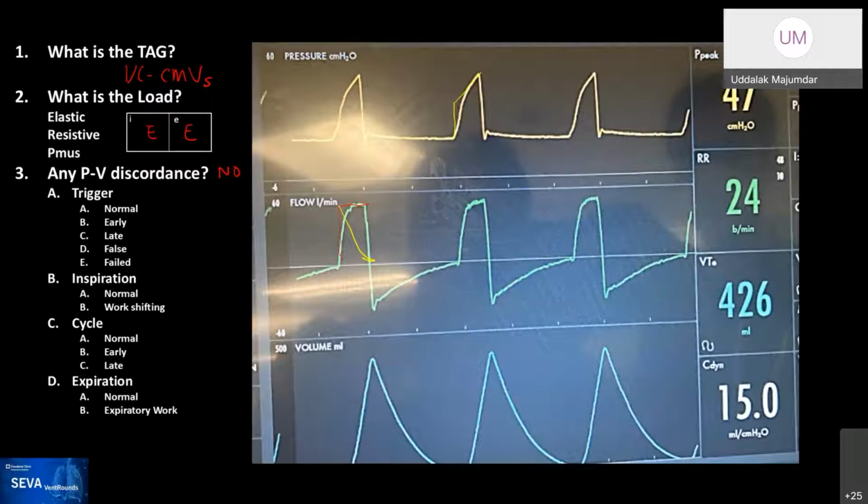Do you see any evidence of patient activity here? Yeah, true. No, right? So that makes no sense in the book. Now, if you're talking about somebody who is spontaneously breathing, it may depend where the patient is and how they are asking for the flow, and there may be some role to adjusting the rise time in patients that are spontaneously breathing, in pressure support or any of these modes. But otherwise, in a patient that is passive, as this patient, that makes no sense.